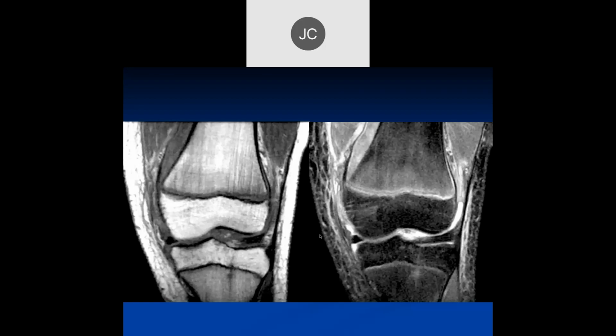All right, so a skeletal immature patient. I see some abnormal signal maybe in the growth plate in the proximal tibia. Is that something going on there? This looks a little bit like something we saw last lecture, right? Yeah, I think this is normal.